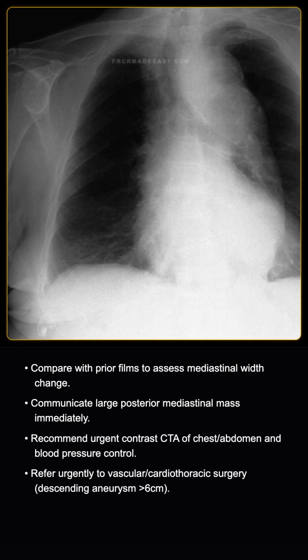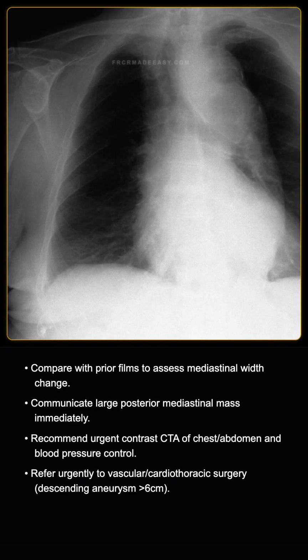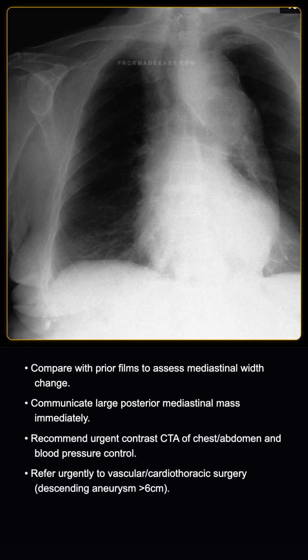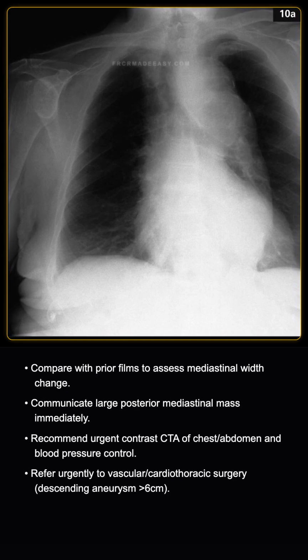I would compare the chest radiograph with previous films to assess for any interval increase in mediastinal width. I would communicate the findings of a large posterior mediastinal mass with curvilinear calcification immediately to the referring clinician due to the high risk of a thoracic aortic aneurysm.